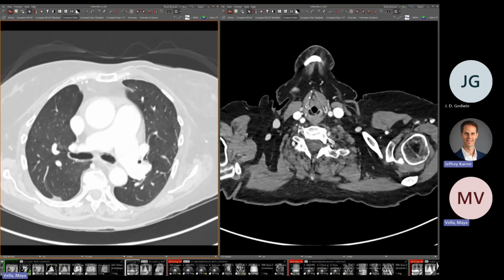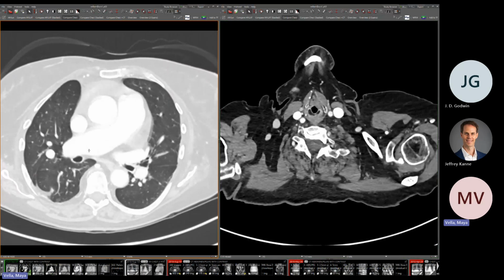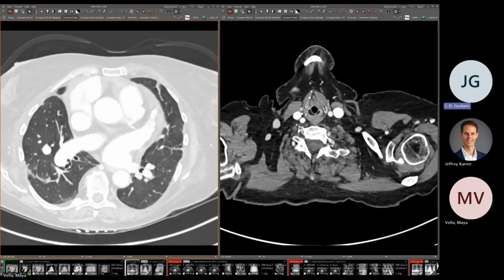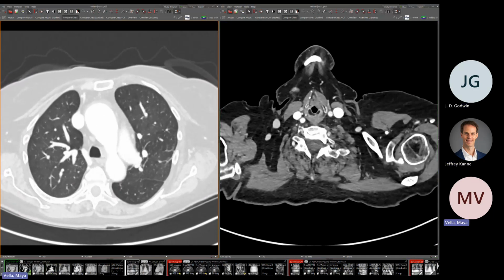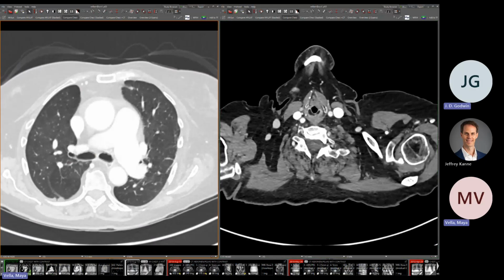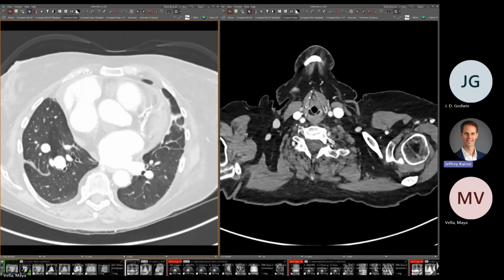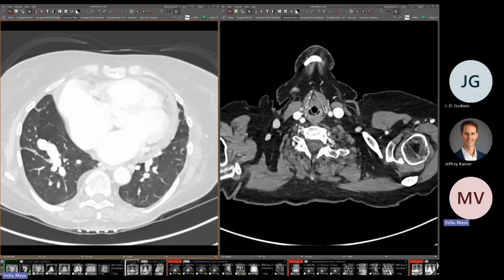It looks like they're missing some segments, as they often do. Exactly. And how many fissures do we have on the right? On the right-hand side, we have one weird fissure. Yeah, we get this one squiggly looking fissure. And yeah, it's kind of just the one.